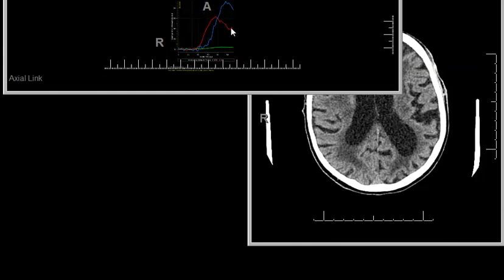The peak of arterial inflow and venous outflow was really delayed, so it's probably some cardiac output delay. Blood has delay in coming in and coming out, so maybe cardiac output failure as well. Anyway, the patient's symptoms later resolved.